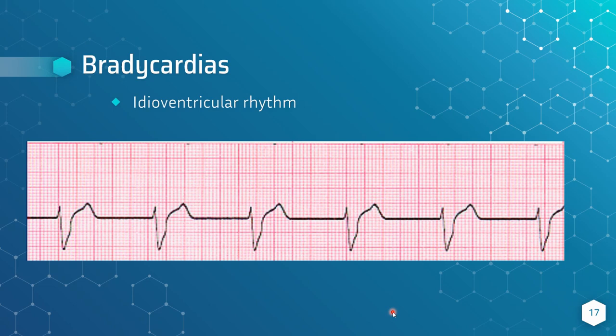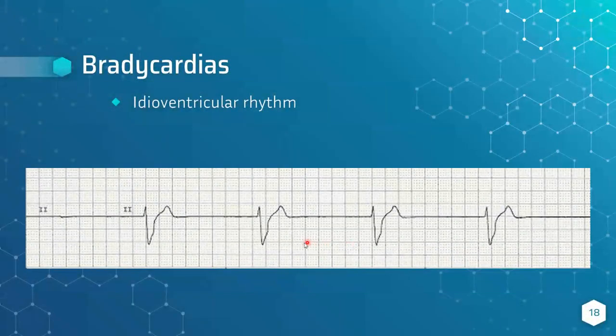So here's a patient here. Again, baseline is flat, the ventricles, the QRS complex is wider, it's regular. It has to be a ventricular rhythm specifically. They call the ventricular rhythms idioventricular. Again, same thing here, regular, they're wide.